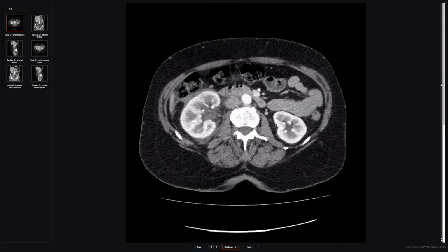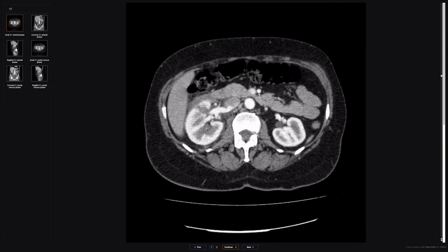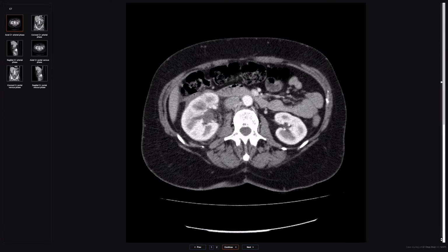the full arterial map of the body, and then you want the portovenous phase where you're concerned that there might be extravasation of contrast and for enhancement of the organs and the mesentery and the bowel for signs of trauma to those structures, okay? So with this patient, let's just focus on the main abnormality. The left kidney is normal, so we'll put that to one side. The right kidney is grossly abnormal.